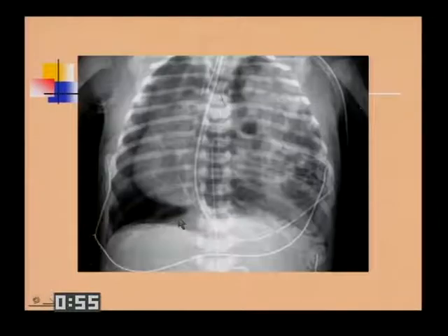A moment on diaphragmatic hernias. They are going to be air-filled. The children will have scaphoid abdomens. You can look at the tube. And if the stomach is in the thorax, it's a much poorer prognosis than if it's other bowel loops. And I think it just indicates the extreme volume of what's in there.